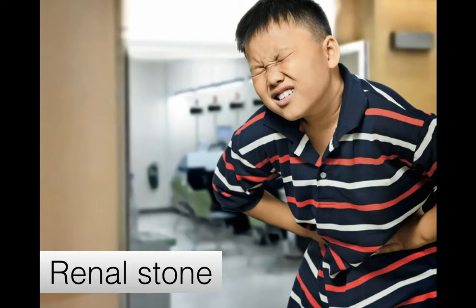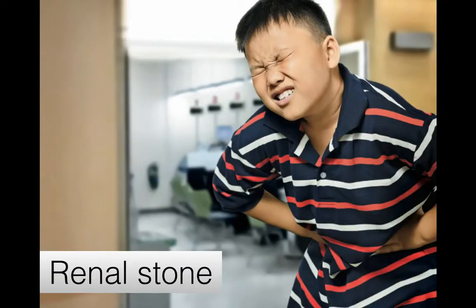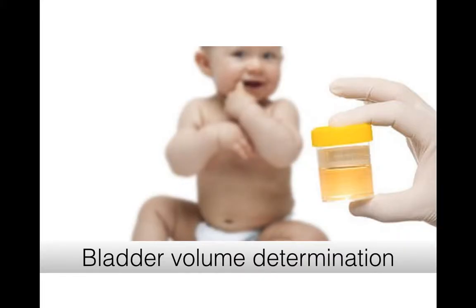But for those teenagers, the situation may become more prevalent. So when we encounter this kind of situation, we may scan for gallstones and renal stones. And then I think for the pediatric applications of ultrasound, the most important is to determine the bladder volume.